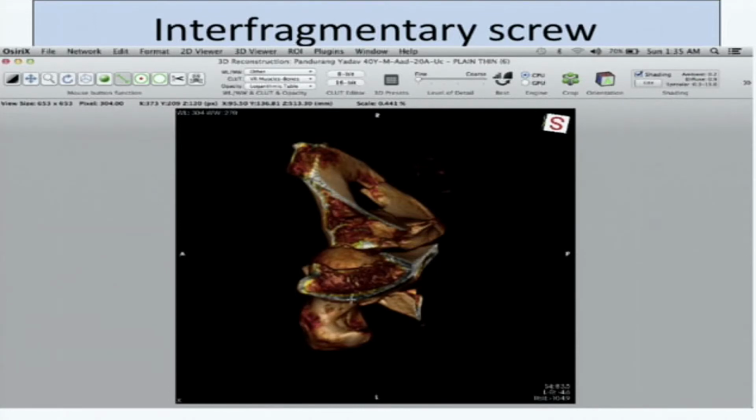So that is the distance when it has already been displaced, but we can take a separate length, and I can get the approximate length of the lag screw.